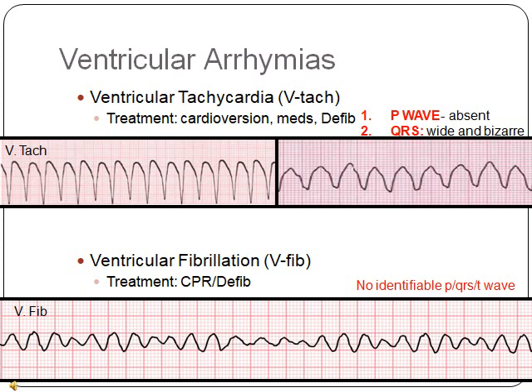It's when the ventricles get chaotic, unsynchronized signals, so they just keep quivering, and the heart is not pumping any blood out from the ventricles, so it's lethal. What you're going to see for ventricular fibrillation is irregular waveforms with no amplitudes. So basically, there are no identifiable P waves, QRS, or T waves, as you could see in the picture below. These are very lethal, but they're easy to tell on EKG.